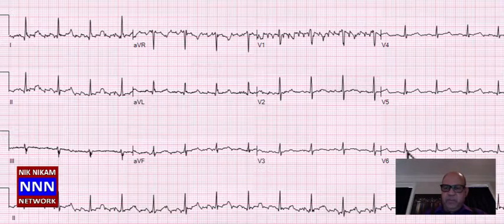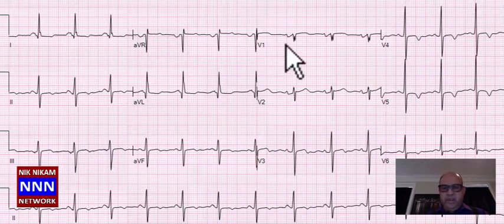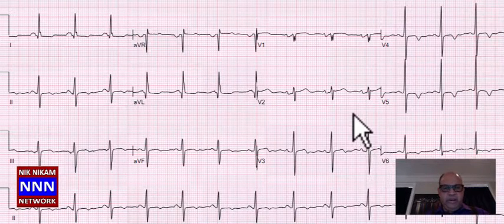The T waves need to be really nice, smooth, rounded, and upright in all the leads except for aVR and lead 3. If it is not, then we are looking at non-specific T wave changes. So those are some of the minor findings in this electrocardiogram. Okay, we have a sinus rhythm with left atrial enlargement and some increased voltage in the lateral chest leads, along with some ST-T changes, possibly suggestive of mild left ventricular hypertrophy.